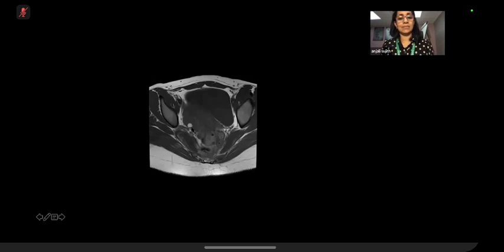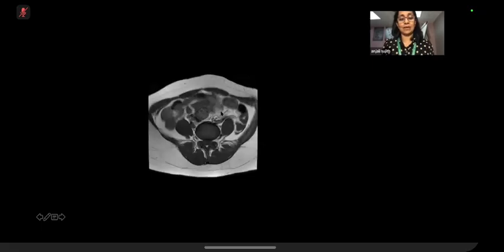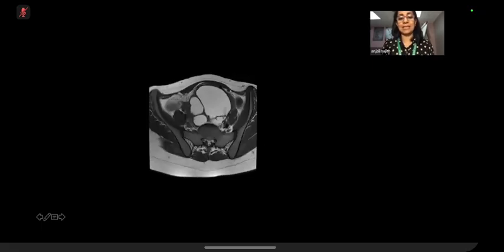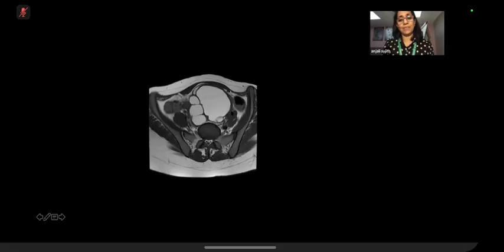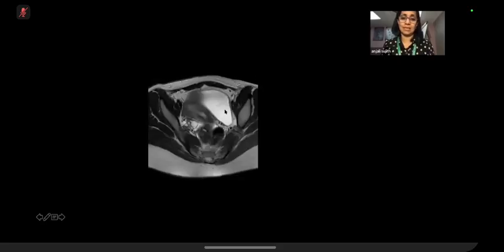Okay, and on axial T1, you can see an incidental small hemorrhagic follicle within the right ovary. You know that the normal cavity does not have blood within. The hematometra is within the non-communicating rudimentary horn. Okay. And this appearance of a multiseptate cystic structure, it was more clear that this multiseptate area was a tube, which we actually saw on the sagittal images. Axial fat sat confirms that it is blood.